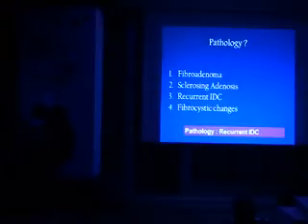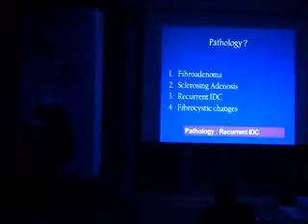Now, the message here: whenever you have an equivocal mammogram, an equivocal ultrasound, and the patient did an MRI with positive MRI findings, a second look ultrasound is essential. Don't just discard the patient like that and write down your report. No. Bring her back, have a second look ultrasound, like in this case, and then you will find what you're looking for, in most of the cases.